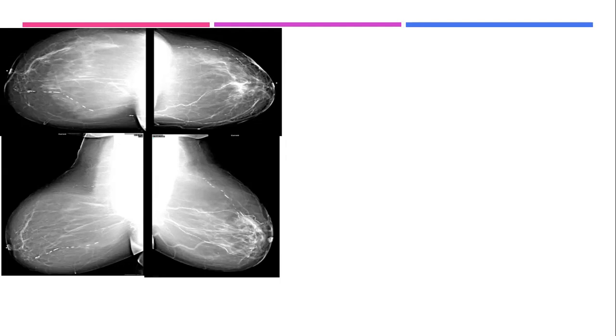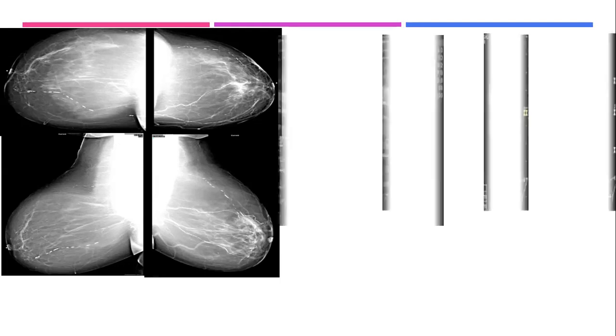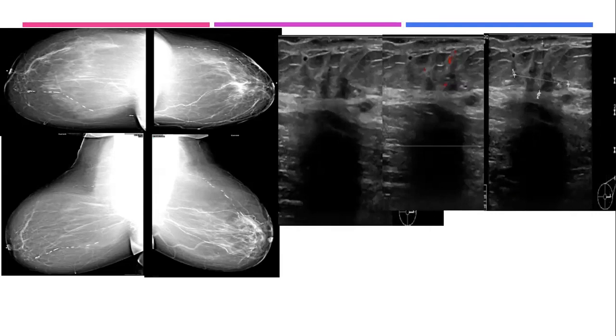The patient came, I had done this mammography for her, and usually we have technologists doing breast ultrasound. She told me the study is negative, nothing is there. Okay, and this is her ultrasound. Would you appreciate anything?